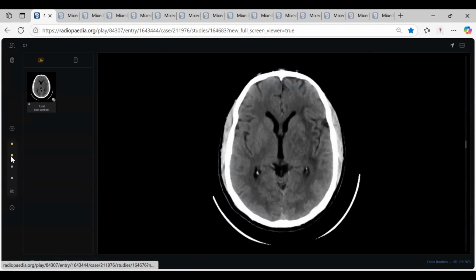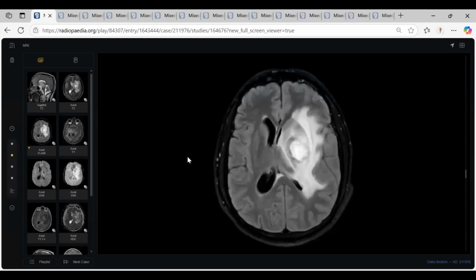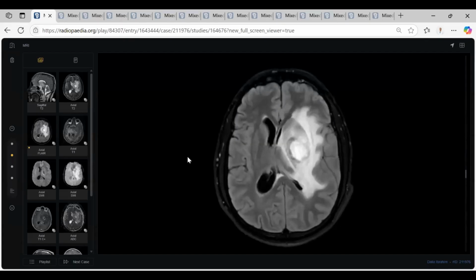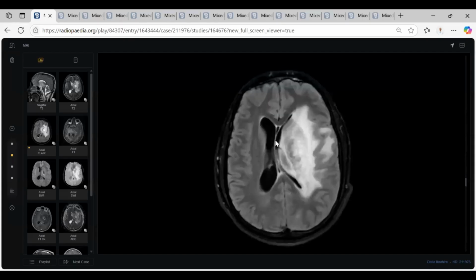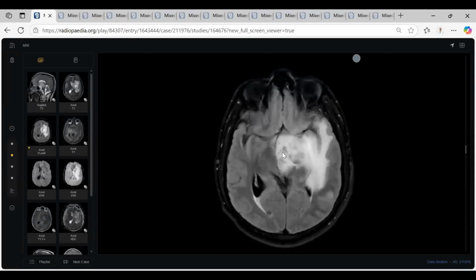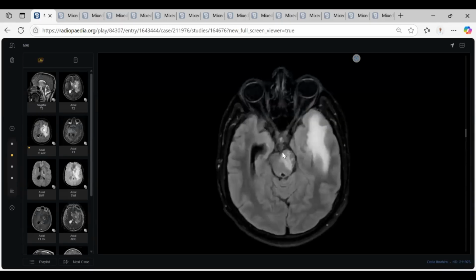When we did an MRI, the MRI confirmed the CT finding. I'd like to thank you because you did very well when you mentioned the midline shift and mass effect, and you should tell the examiner if there is herniation or not.